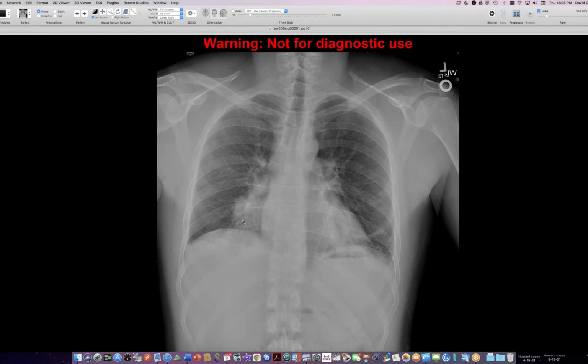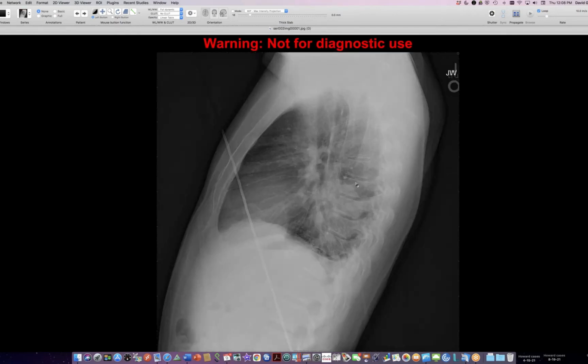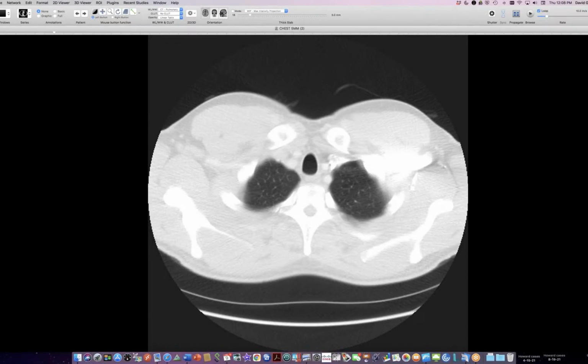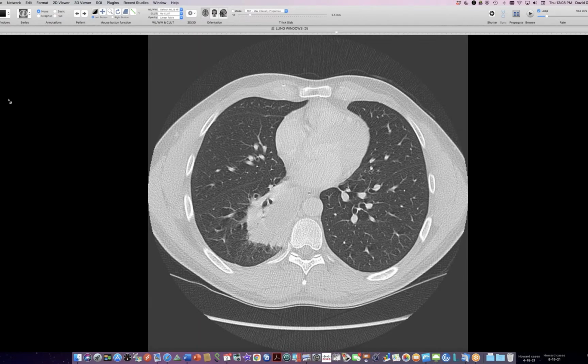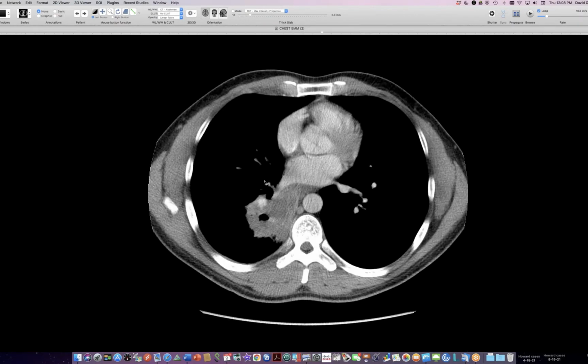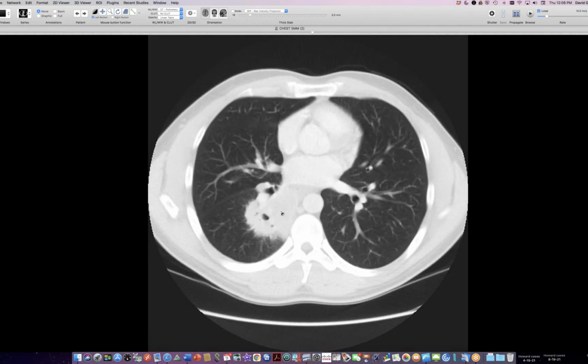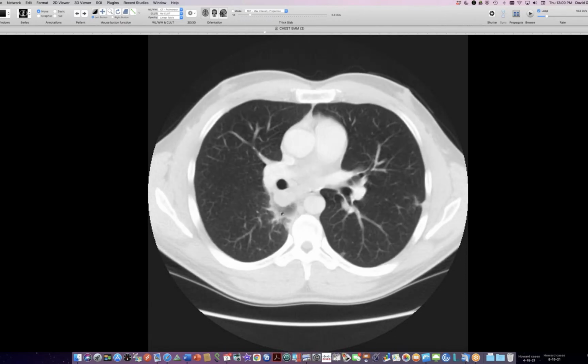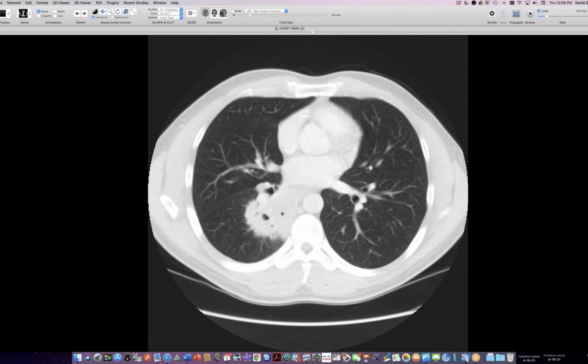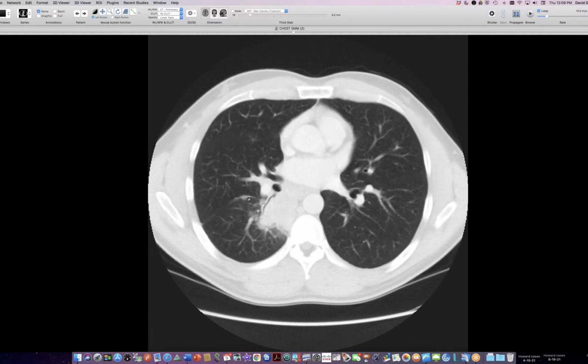And then this person has a very cruddy looking right lung base here, and I'll show you a lateral, a big blob back here posteriorly in that right lung base, and then had a CT scan that shows a big central mass here. Let's look at it with a soft tissue window, and you can see that it's got some low attenuated components to it. This was biopsied and it was a squamous cancer. This is a young person, I think. I'll check the age, but I think this person is only 29. So kind of young age for regular cancer. There's some other nodules here too.